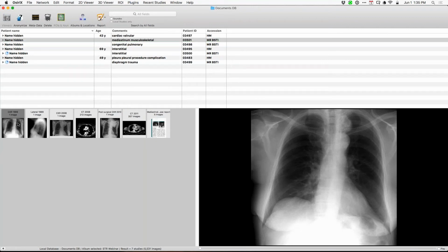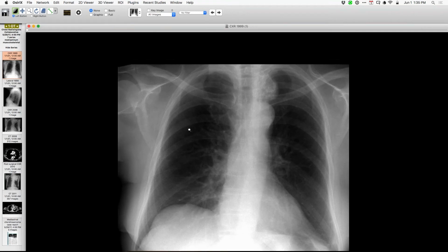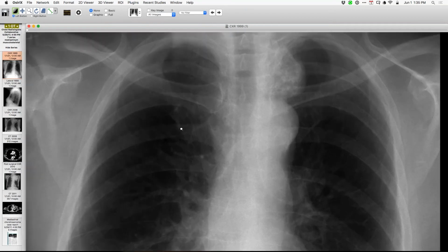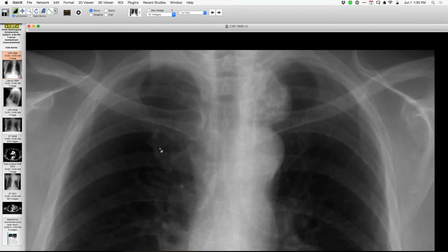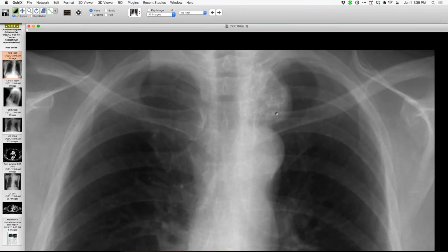Okay, here is the next case, and then Jeff, I can show more cases, but let me just stop after this one. So this is a radiograph from 1999, and I'm going to zoom it up so you can focus into the finding. So there is an abnormal opacity that projects superior to the aortic arch on this frontal projection. We can see that its interface with lung, where we do see it, is quite smooth.